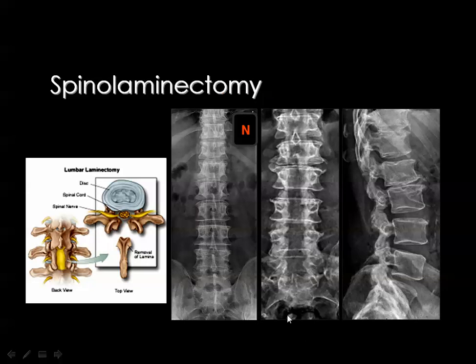In the previous days, this was an extensive spinal laminectomy from, let's say, L2, 3, 4, 5, and you can see absence of the spinous processes compared to the normal spine, where you can see these are the spinous processes normally located in the midline.